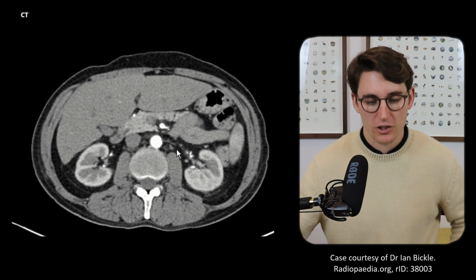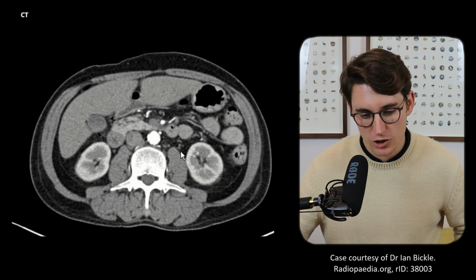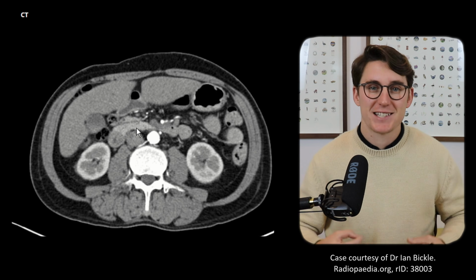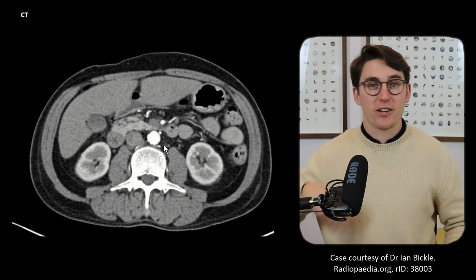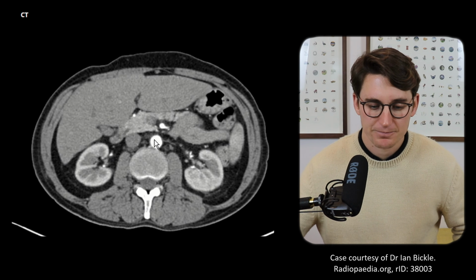They're often very small and often can't see them. And they run on the anterior aspect here of the psoas muscle all the way down into the pelvis. And that's a remnant of the descent of our gonads as we are developing in utero. And that gonadal artery in men will go through the inguinal canal before heading towards the testes.